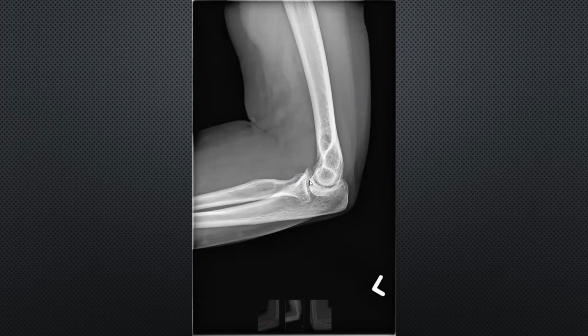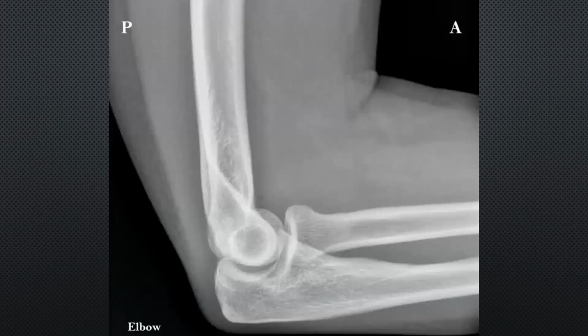And regarding the joint, what about joint congruity? The curve is normal, and the curve here is normal. So it means normal, right? Okay. And what about this X-ray? Normal X-ray, but adequacy? Adequate. You can see the soft tissue here, here, here, and the humerus. You can see the ulna and radius. So the elbow joint is adequate, right? Alignment also normal.